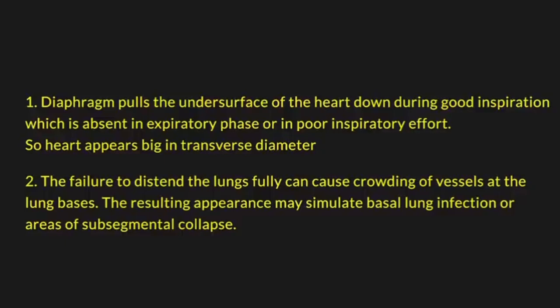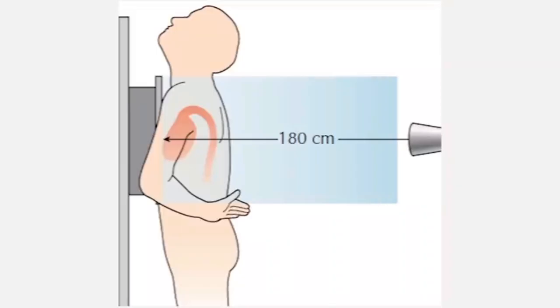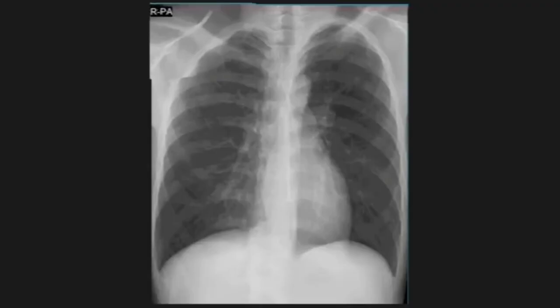And crowded vessels look white on the film. Which looks exactly like pneumonia. We call it an expiratory film artifact. Wow, so you really don't want to put someone on antibiotics for a lung infection that's actually just them breathing out. Definitely not. Okay, so then we have the trickiest one. P for projection. This is the AP versus PA trap. It's essentially an optical illusion, right?